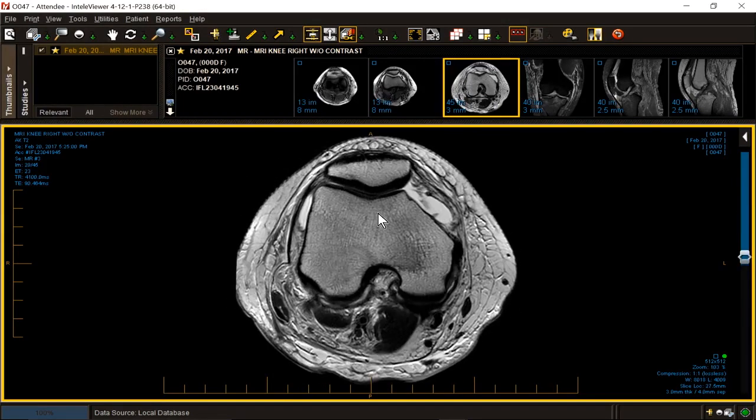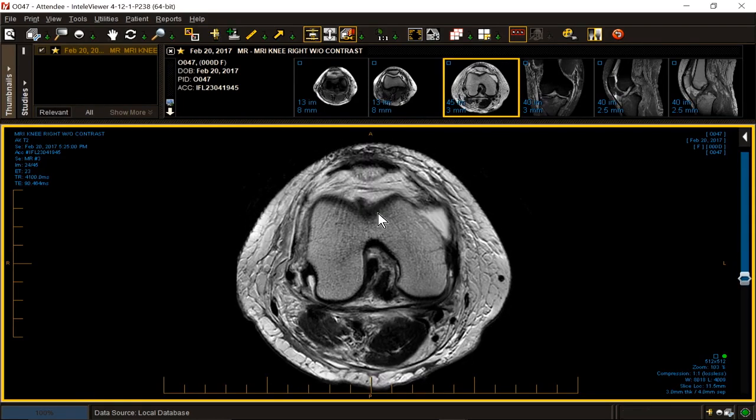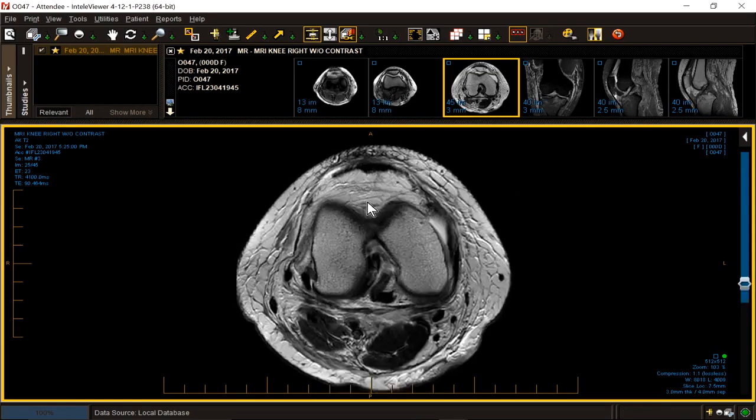Okay, you didn't come here to see fractures, that's for sure. You came here to see a lot more. Evaluate for medial tibial plateau fracture, possible hyperextension injury. Evaluate status of ACL and menisci. Age, 18.